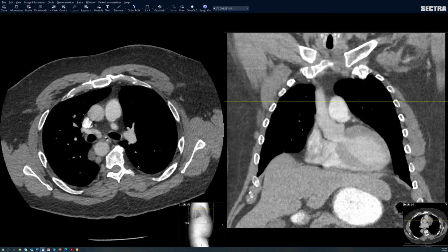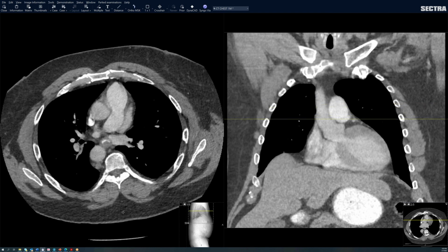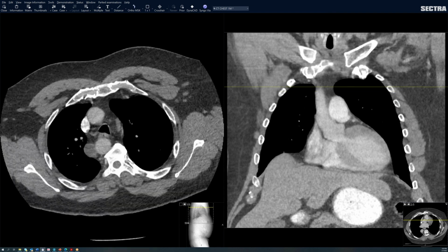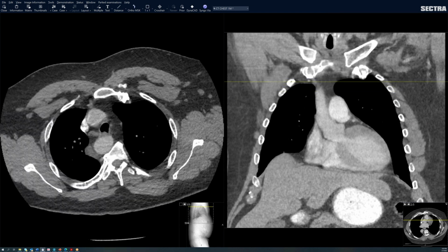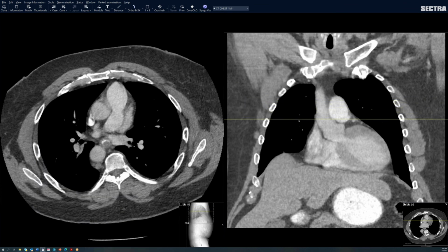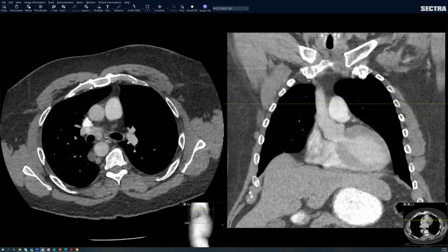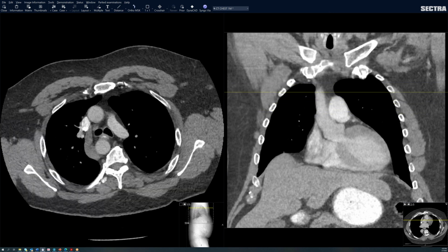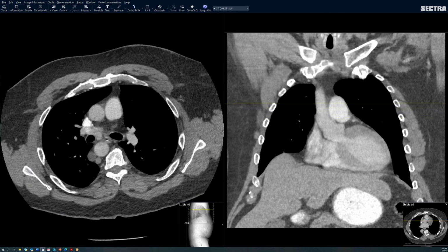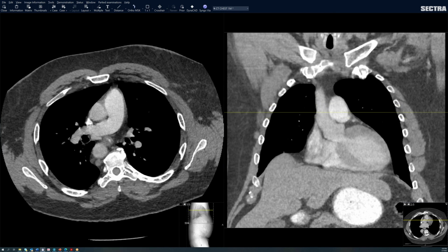Yeah, exactly. So just the orientation of the branching and the branching pattern of the pulmonary arteries. We should see both pulmonary arteries at the same level. Like the bifurcation should be at the same level, but here it's different. So we see first the left pulmonary artery and then the right pulmonary artery after that. One point is that the left pulmonary artery has a superior takeoff compared to the right. Typically, when we see PA bifurcations, you see them come off together. Okay, that's one.